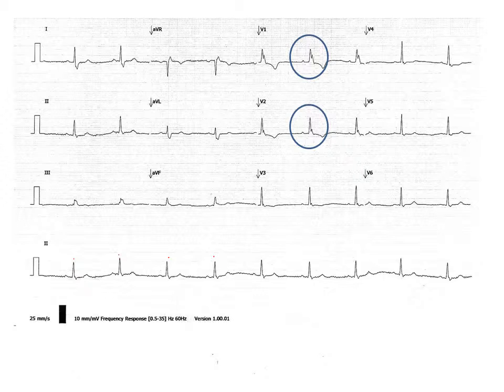Are there P waves? Well, kind of hard to tell, but you can kind of make yourself believe, yep, there's probably a P wave there beforehand. You do have a little hump that is more than this static interference or whatever's going on in this lead. You can even look at some of the other leads like V1 and V2 and see, do you see a P wave? When I come up to V1 and V2, yeah, I definitely see a P wave. So there's P waves. So this is sinus. It's regular. All right. The lines can't be seen good on here, so I can't really calculate out the rate, but don't need that right now.